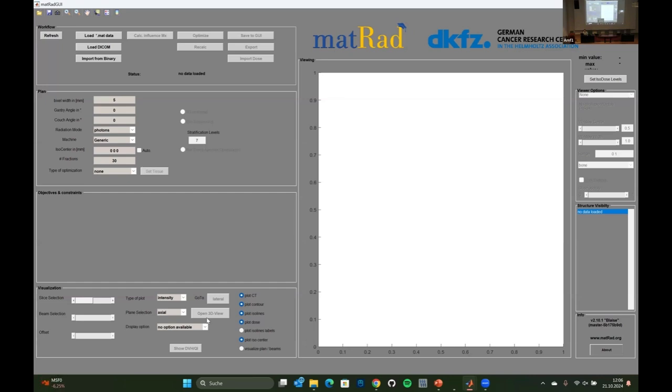is not very efficient in computing 3D renderings. So this might take a bit. It doesn't take 2 hours, but it takes maybe a minute. So you might get stuck if you click this too euphorically. I know that users often see all these options and they like them.